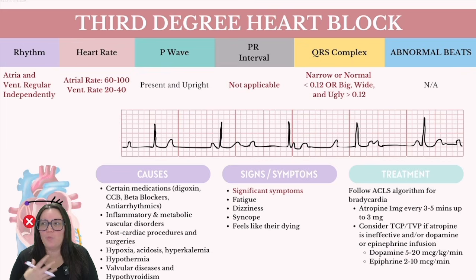So you might be questioning, why is this heart rhythm lethal? Well, a third-degree heart block is lethal because the ventricles rely on their backup pacemaker systems known as their Purkinje fibers, which are primarily slower and less reliable than our normal sinus node. This can ultimately lead to reduced cardiac output, leading to severe symptoms if not adequately treated. And the risk of asystole increases greatly with this rhythm because it's relying on those escape rhythms in order to make the ventricles contract.